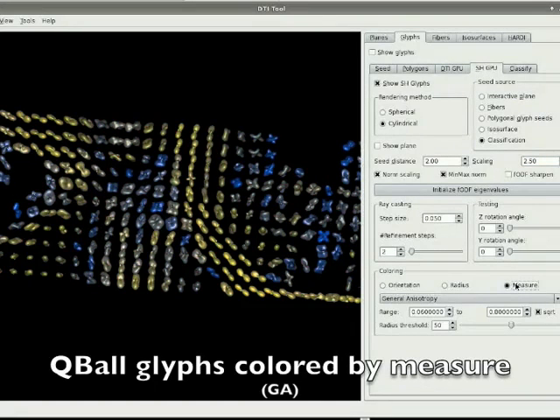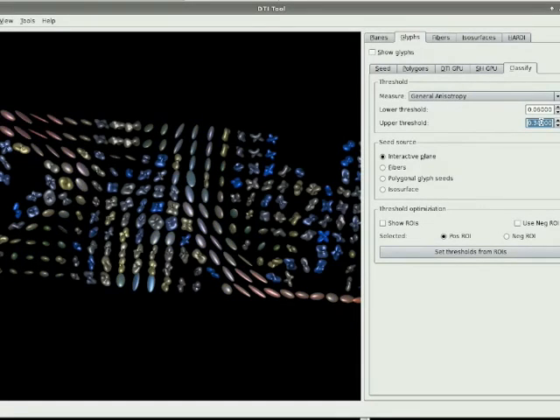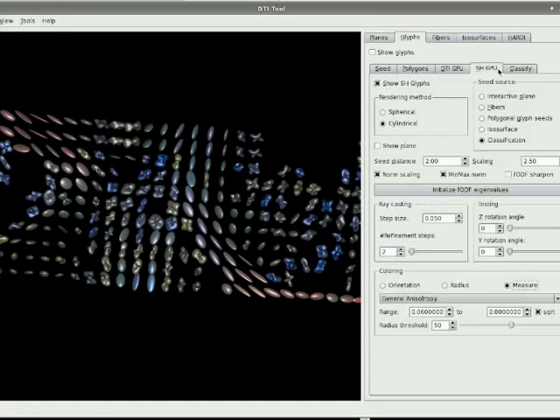By changing the color coding, we see that more insightful information can be obtained. With yellow color are the Gaussian profiles, or the profiles that are more likely to be Gaussian, and with dark blue are the ones that can be classified as isotropic noise. We can see that even though these profiles look like clear crossings, they might come from the ventricle and can be easily masked off.